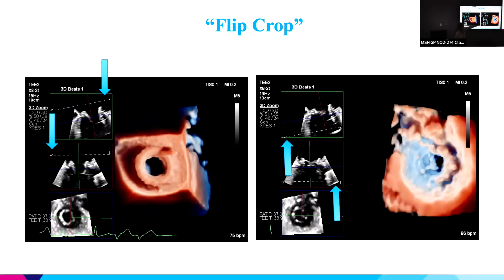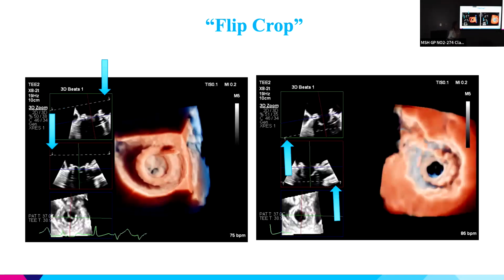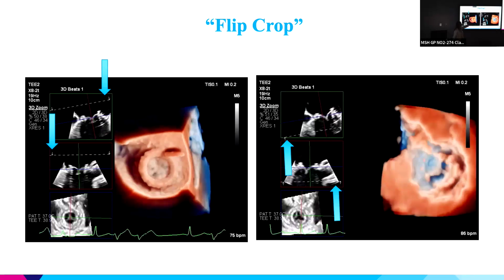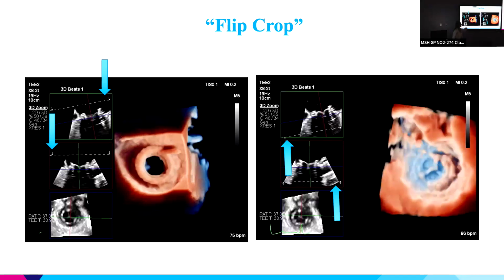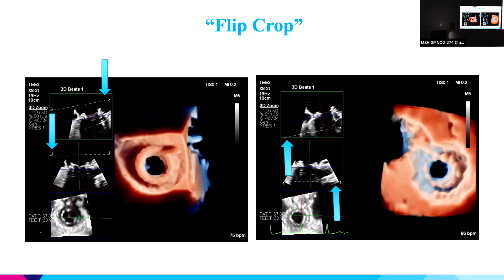I do have an example. So you can see here, that's what it would look like, okay? So you can see the difference. It's a subtle change, but really I'm looking, left atrium looking down at the valve, left ventricle looking up at the valve. It's great for pannus, great for HALT, great for trying to figure out what's wrong with the prosthetic valve, if anything.